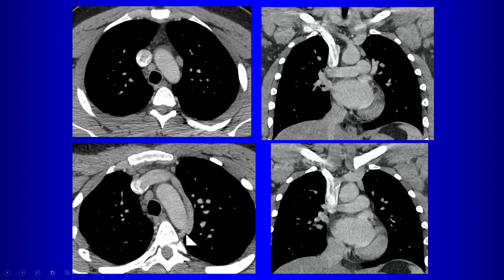On the left side, you can have the left superior intercostal vein here as it arches forward to join the left brachiocephalic vein. And if it happens to run parallel to the aortic arch, right, that gives you the aortic nipple on your chest radiograph. Okay, by the way, this structure over here, that vein, what is that vein?